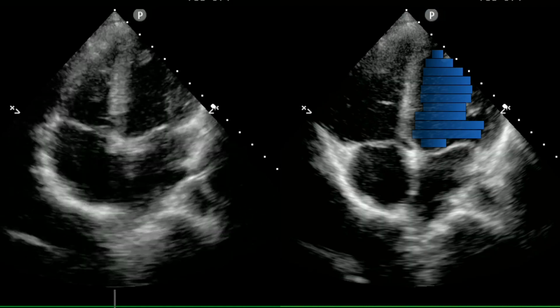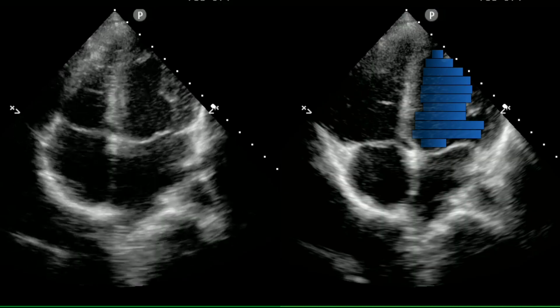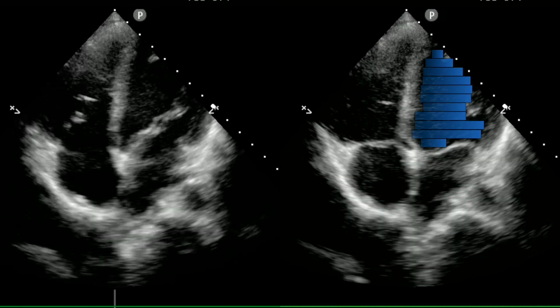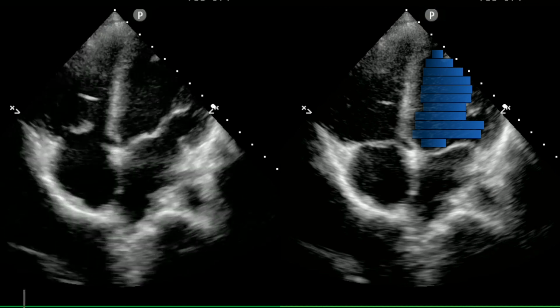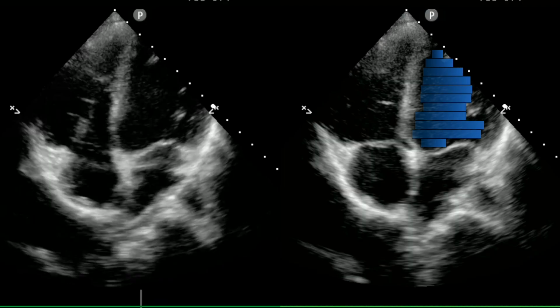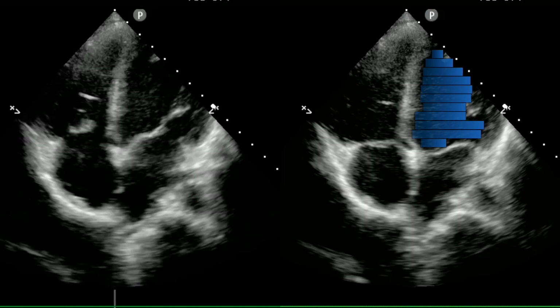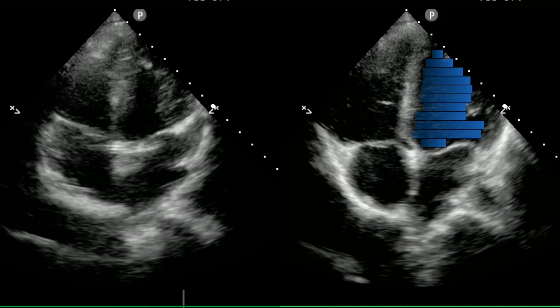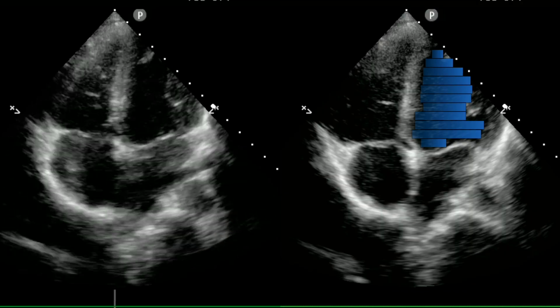And it's going to basically do that calculus equation, or integrate the area under a curve, and then with the 2 dimensions, you can get a volume and really say, what is the volume of this ventricle in diastole? And then what is the volume of this ventricle in systole? And we can compare the two, and we can get a fractional proportion of the change, and that is our ejection fraction. So that's how this Simpson's method happens on its own.